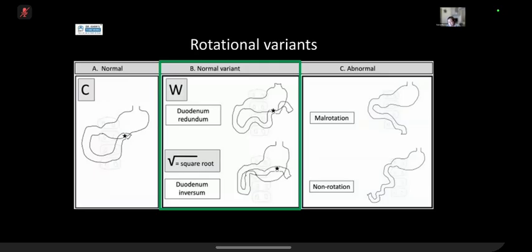But I would think your duodenal web often gives that classic windsock appearance. But I know we've had one case where we thought it was, but it turned out to be just a stenosis. They didn't think it was a web. Personally, I think the difference is more something macroscopic than radiological.